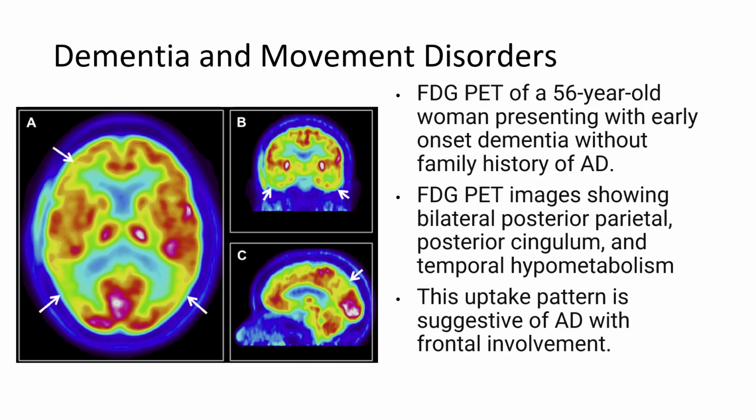Now, this is in one of the earlier stages. As this Alzheimer's would progress, you would see the brain atrophy and you would see less and less of the red, less and less of the gray matter. For decades, FDG was the only FDA-approved radiopharmaceutical for dementia and movement disorders. It is still recommended for assessing atrophy and areas of hypometabolism and looking at the progression of the disease or just correlating with other imaging.